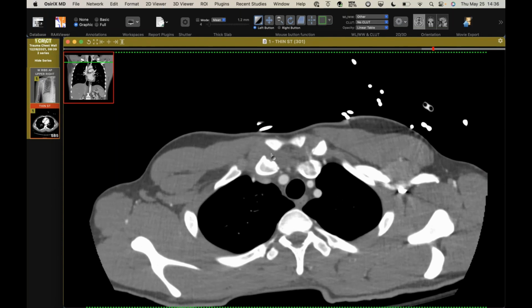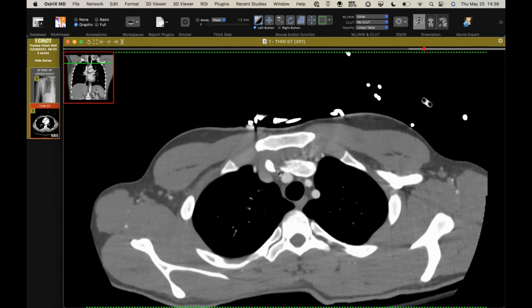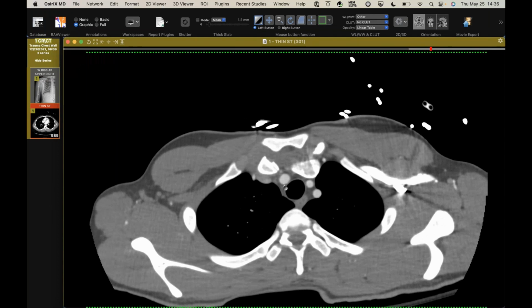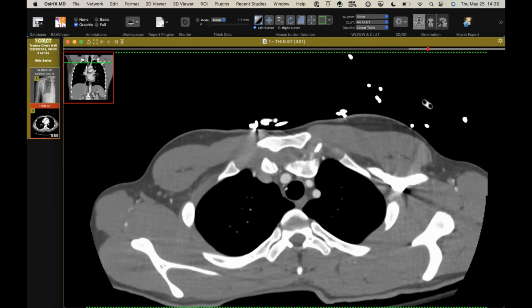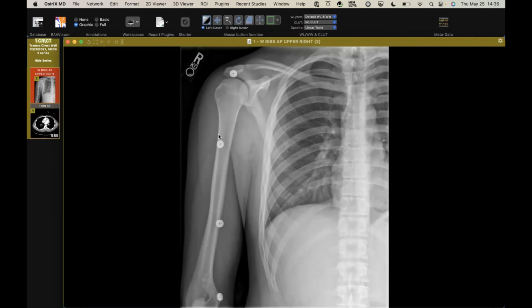It can be associated with impingement of the brachiocephalic vein, also injury to the right brachiocephalic artery or any of its branches. But it looks like in this case it was a pretty clean injury. Now, he had a portable radiograph on the outside that wasn't particularly very good.